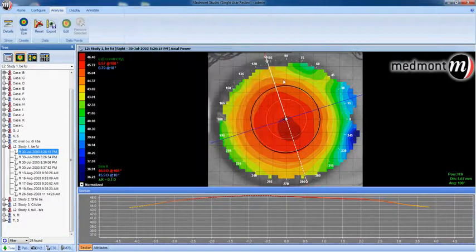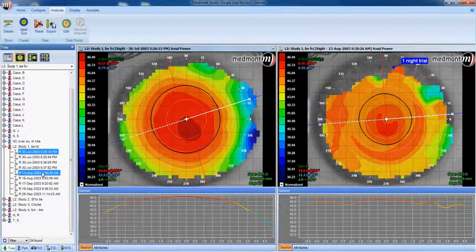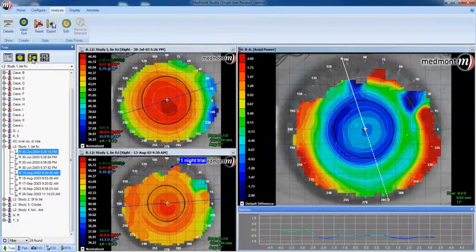Now let's send the patient home with the lens and analyze the post-treatment response. We select our best baseline map, then our post-orthokeratology or post-treatment map. This is where we use the subtractive map function or the comparison map. Click on the icon that looks like 3 topographies on the same button, and that brings up your subtractive map.